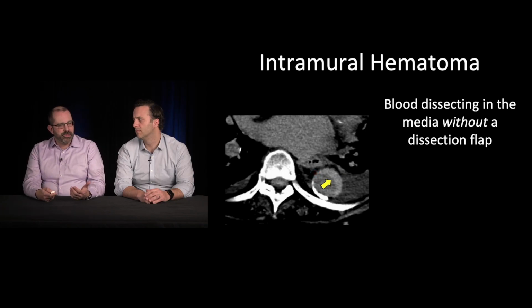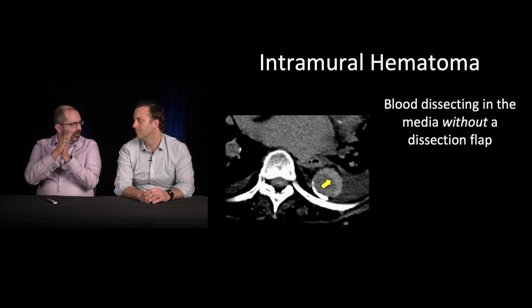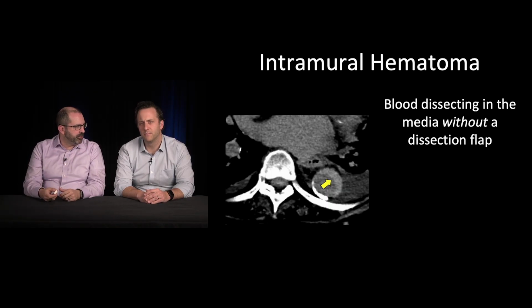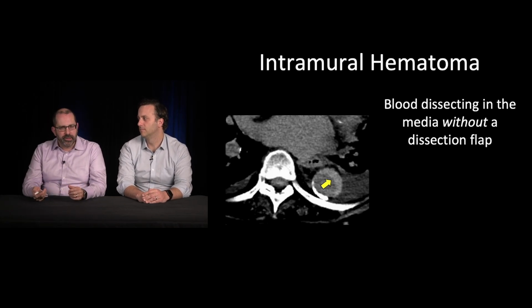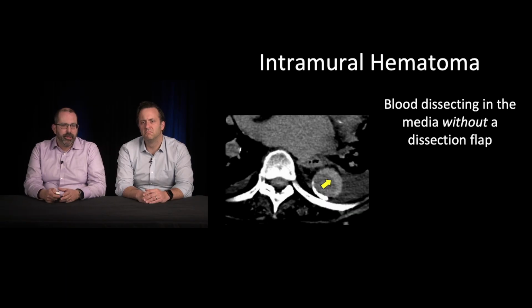The problem is when you bolus them with arterial contrast, that bright contrast can obscure that intramural hematoma, very much like when you have an acute subdural sitting up against bone, they can sort of merge together. The same thing happens here. So we do the non-con to look specifically for this intramural hematoma. I used to think they were fairly rare, and I think I've seen at least 8 or 9 this year alone. So they're definitely out there. And again, we treat them like a dissection.